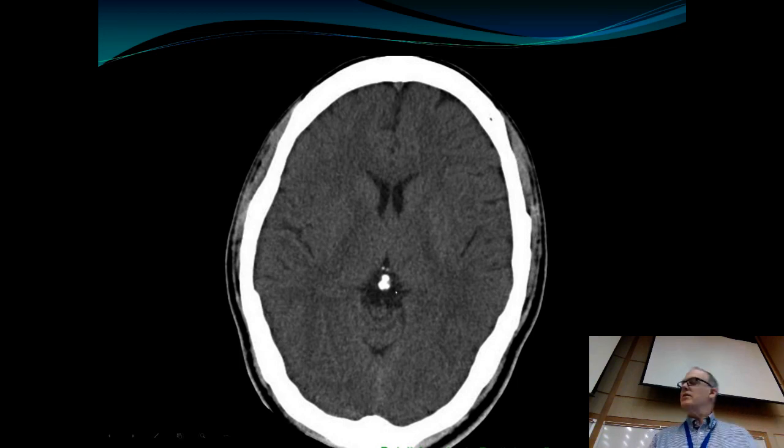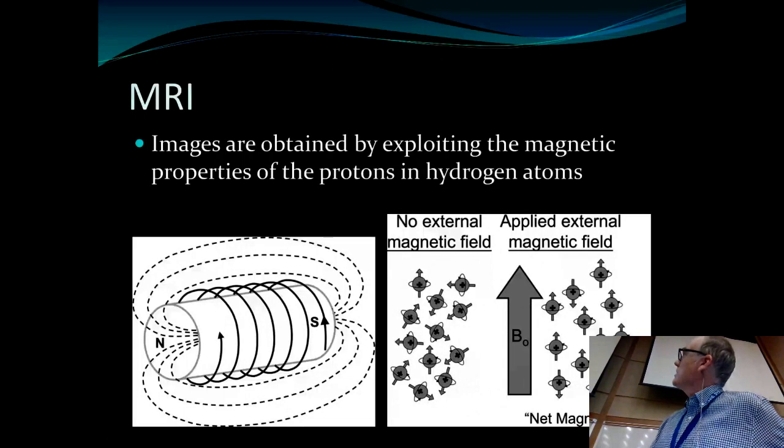The other important thing we've mentioned a few times, but when you're looking at a CT or an MRI scan, it's obviously important that you know what is right and what is left. Okay, so you always have to imagine the patient lying on their back with their feet coming out toward you. Right, so this would be the right, and this would be the left hemisphere. And so we'll go over some of these structures here, just making some general points for now.